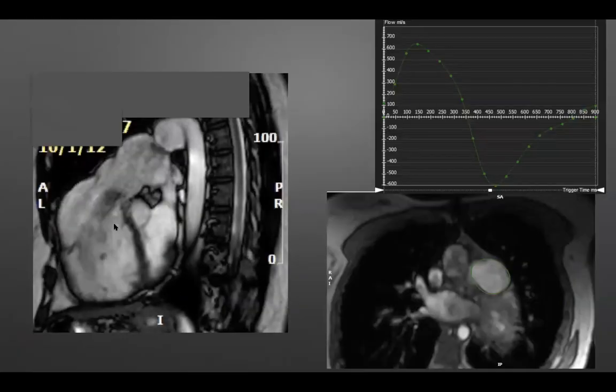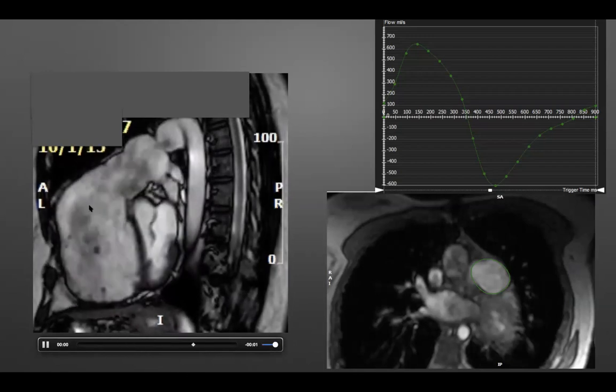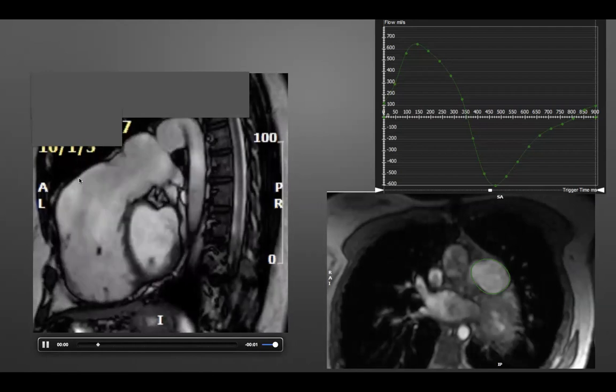Cardiac MRI is often performed in patients with Tetralogy of Fallot. This image is a cardiac MRI showing the RV outflow tract, remnants of the pulmonary valve. And what you see is this regurgitant, dephasing flow, which is pulmonary regurgitation. You also see that there's normal contractility of the RV here, and then basically akinesis, or no movement, of the RV outflow tract here.